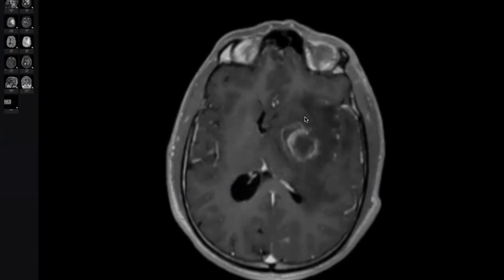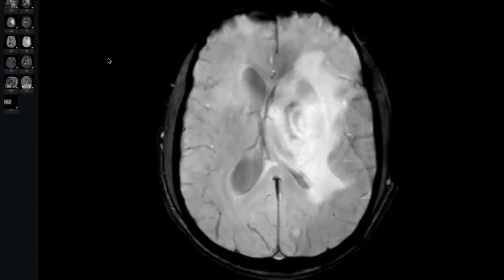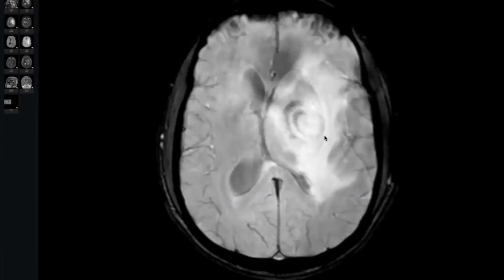What is your management, doctor? Yes, I will refer the patient to the neurosurgical team for urgent decompression and start of anti-toxoplasmosis medicine. Okay. Other differentials are also lymphoma. Here, my colleague, very obvious: 1 ring, 2 ring, concentric target sign. Yes, concentric target sign.